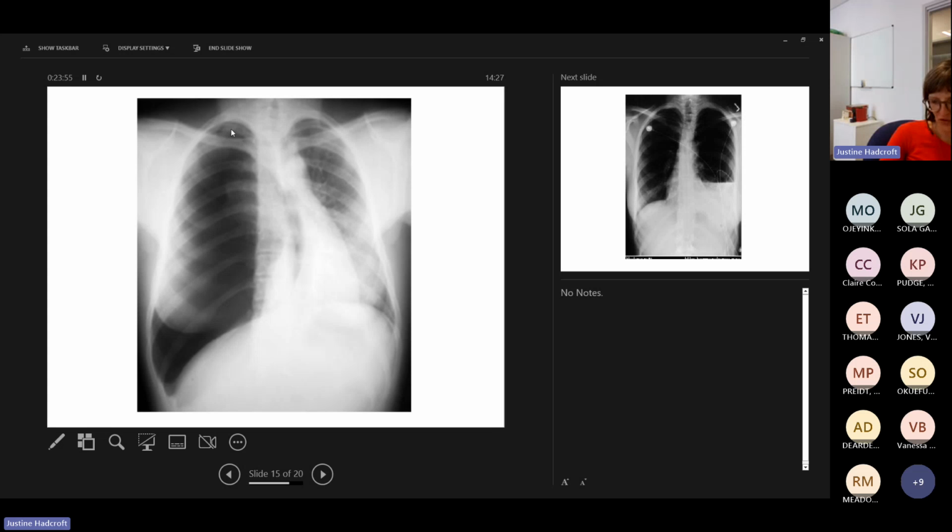You see this on Casualty, don't you, on the television, where they put a Venflon between a couple of the ribs and there's a hiss and the patient perks up and then you can put a chest drain in afterwards. But you're quite right, that's a tension pneumothorax, which is a medical emergency.